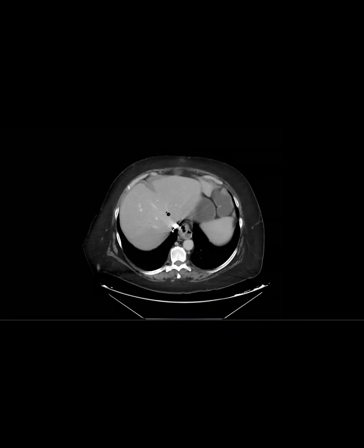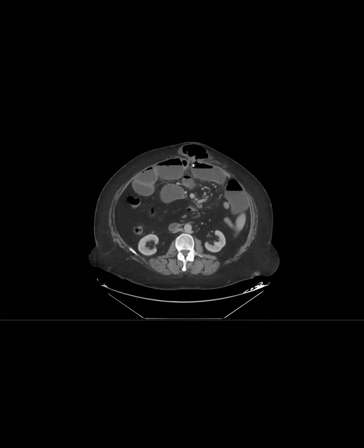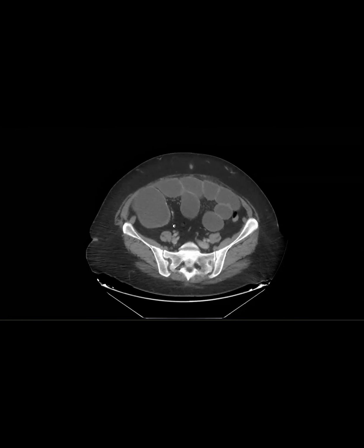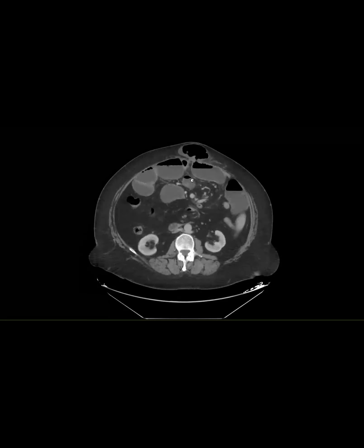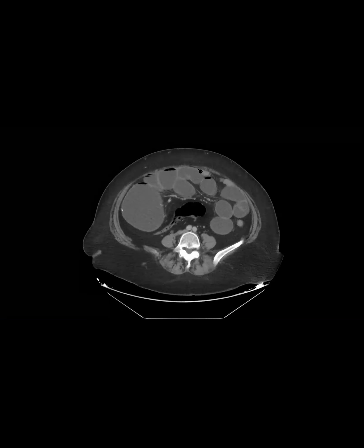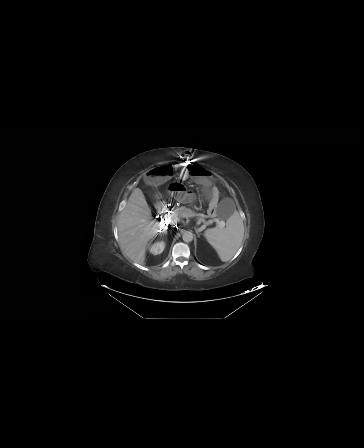All right, so this is a patient with a liver transplant who came in vomiting, and you can see that the patient has multiple hernias, and it was read as small bowel obstruction. So the surgeon called me from the OR and just said, walk me through and figure out which one of these hernias is truly obstructing, because the patient had several. There was one here, there was something above.